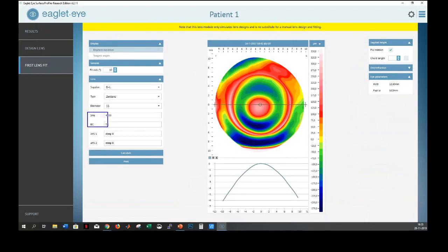Now you'll see on the right side of the screen, we give you HVID. So if you use HVID to select diameter, it's right there on the right side. So actually, I've been choosing incorrectly, because I should have been taking a 17 millimeter, because the recommendation from Bausch is above 11.8, go to a 17 millimeter. But for the example, it does not change anything.